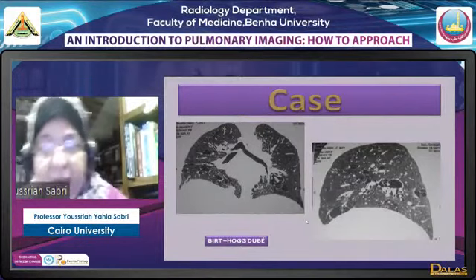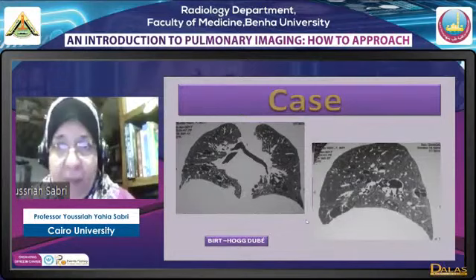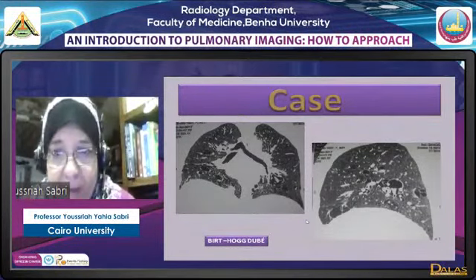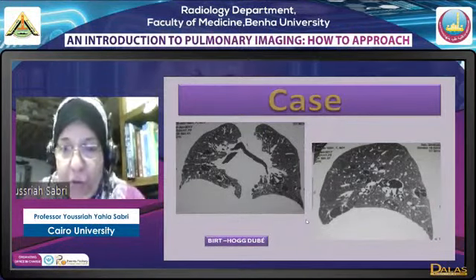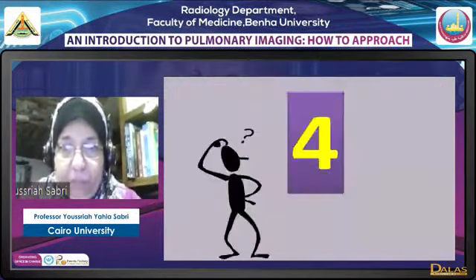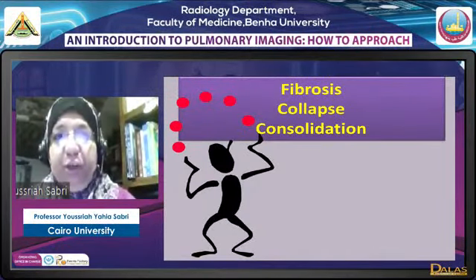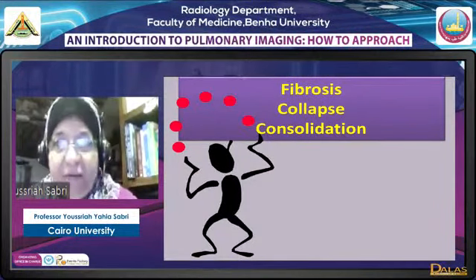Why I'm presenting it here is to tell you there are common lesions that you will meet a lot, but sometimes you will meet something out of the way. You start looking it up, and this is one of the things that are out of the way, the Birt-Hogg-Dubé syndrome. Now we have finished with well-defined lesions. We will shift to opacities that are patchy, that are ill-defined.